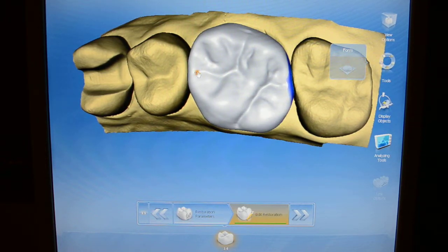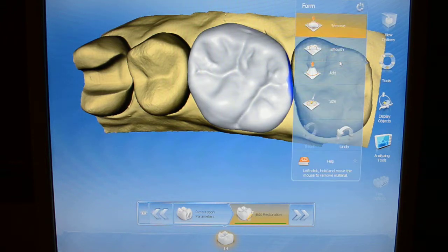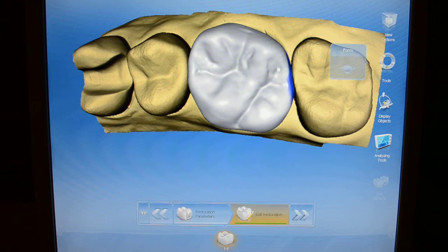And really quickly and really simply, if I come back and I want to smooth it now that I've defined it, I'm just going to keep this trackball moving really quickly and just kind of buzz over each of those little areas. And really, in almost no time whatsoever, we have built a really great looking tooth number 14.